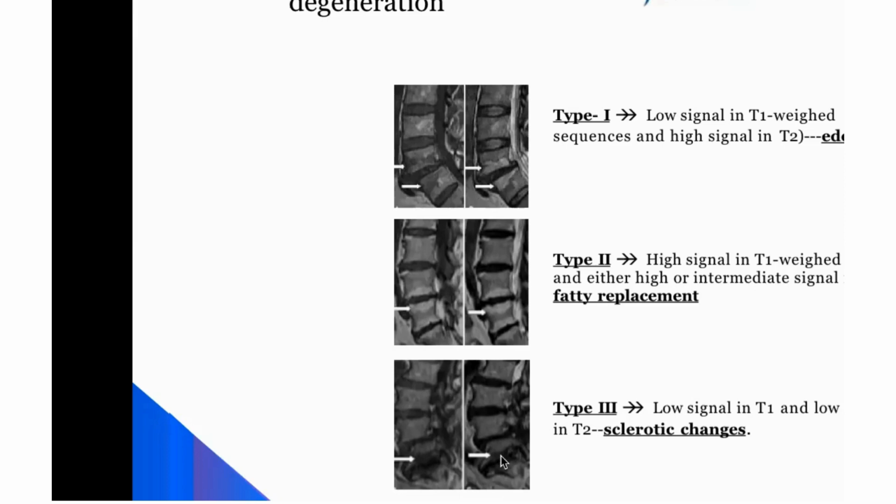Now these are the discs which are not painful. Why are they not painful? Because the disc is totally dry. The end plates are sclerosed. There are no nerve endings over there. Though they will look the most horrible out of these 3, these kinds of discs are not painful.